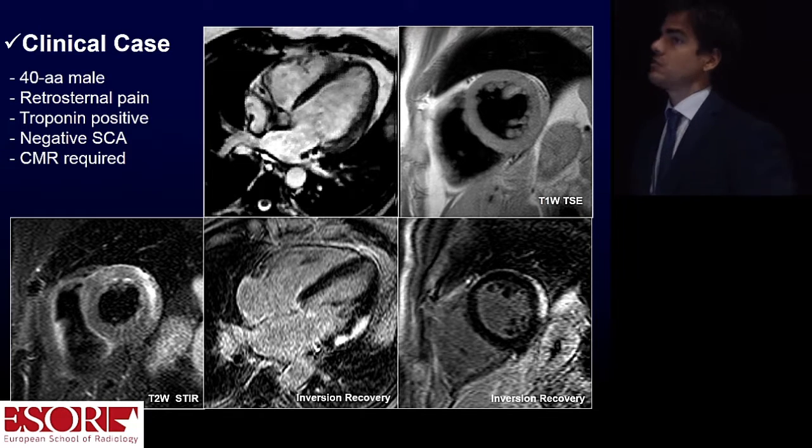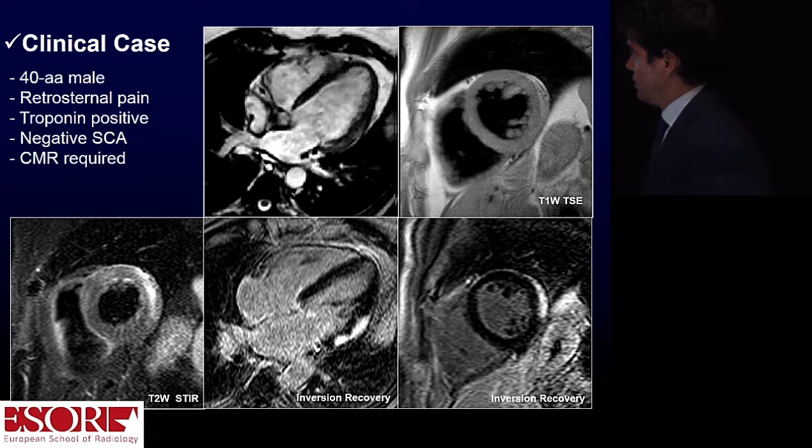If you look at this slide, it's very important. It tells us why this is not an acute myocardial infarction, but why is it an acute process? We have edema here, meaningful of an acute process. We have late enhancement, which is typically sparing the subendocardium, as shown here, and epicardially distributed. So with imaging, we are able to screen and to look at different processes in myocarditis, mainly consistent with myocyte necrosis, tissue edema, and hyperemia.